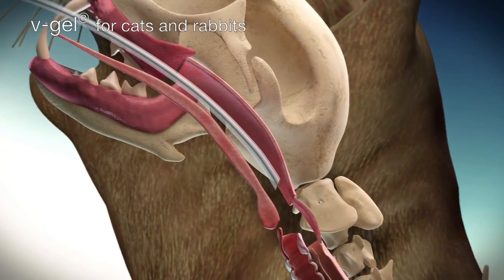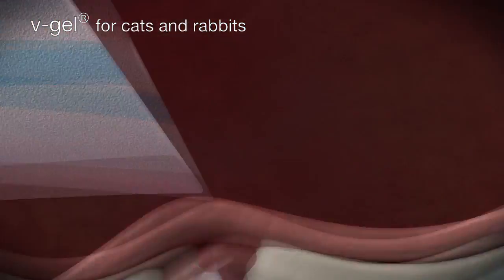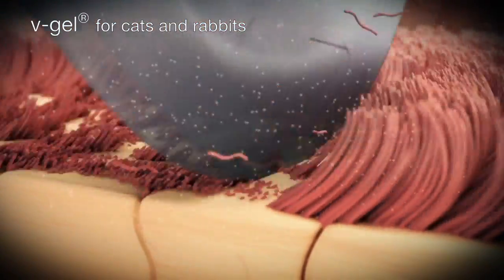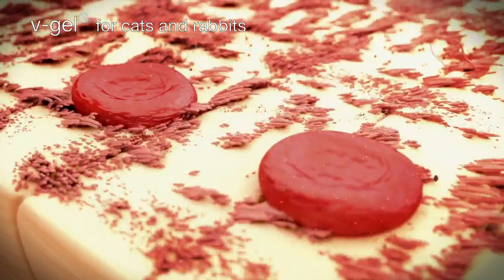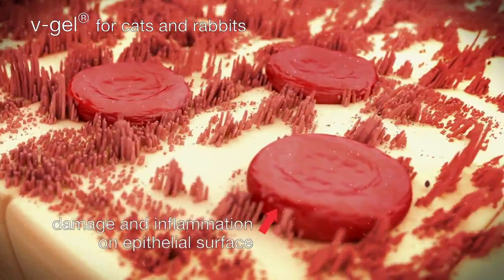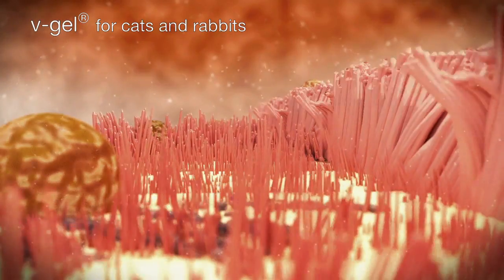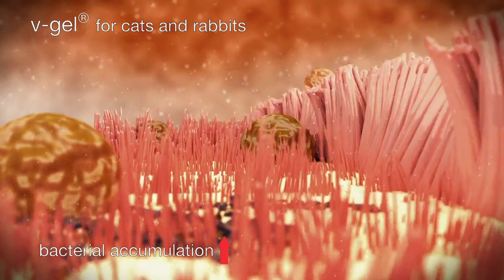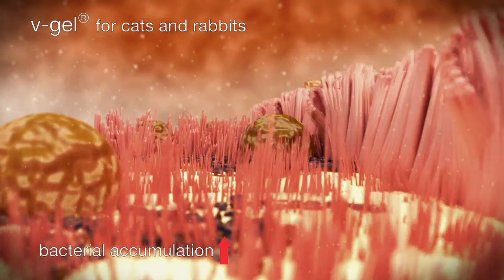During the process of intubation, studies have shown that the tip, the body and the cuff of the endotracheal tube strips the cilia from the epithelial surface. This creates areas where the mucociliary escalator no longer functions. Bacteria and other infectious organisms can no longer be removed from the lungs. This increases the risk of infection and inflammatory reactions and could result in pneumonia.